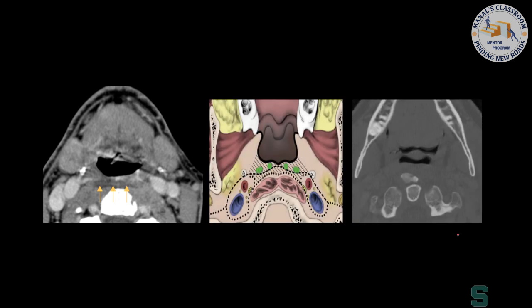Another example here. There's edema involving the retropharyngeal space. Do you see it now? Right there. Got it? Okay. Once you've seen one, you've seen them all. You just have to remember to look for it. Got to remember to look for it. All right, good.